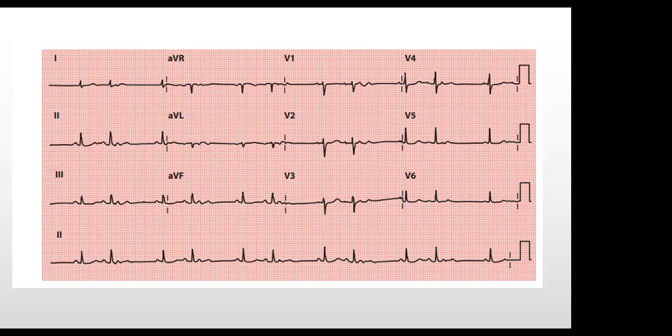But beyond that varied morphology, you can see that there is progressive prolongation of PR interval with a drop, which tells you that for whatever the impulse is coming from, whether the SA node or the atrium, whether you have atrial complexes, the patient has some kind of AV nodal block, which is progressive. I don't know whether my explanation is making sense. Yes, please. Yeah, it makes sense. It makes a lot of sense.